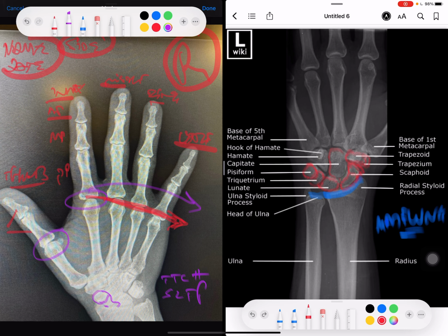You see the white? That's the hook. There's the hook. That can be broken a lot. On this side, it'll be the other way around. She looks too pretty. Try to catch her. Yeah, on this side.